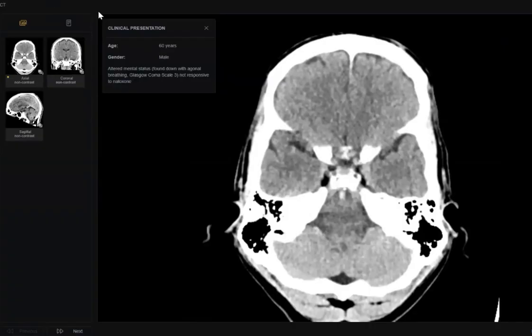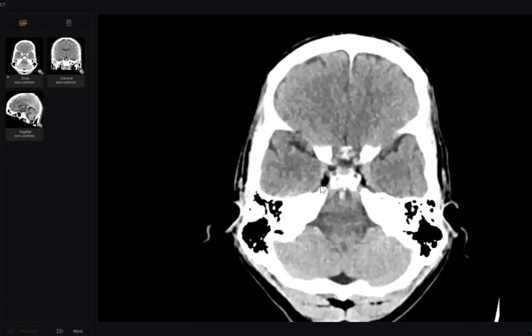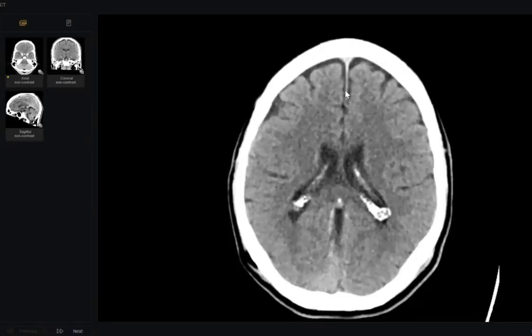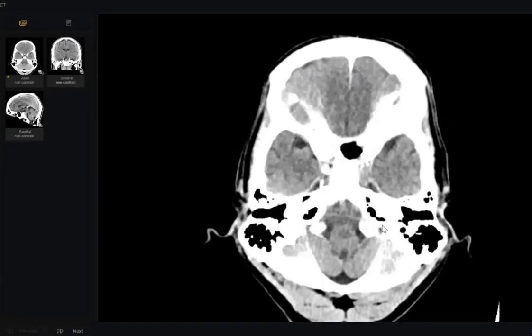An old patient with deep coma and the CT looks normal, without any infarction or hemorrhage. Your next step, before any other review area, is to check the basilar artery. Nothing else. Why? Because basilar artery thrombosis causes severe coma due to brainstem infarction without any supratentorial abnormality. It is acceptable. So that is one key in your exam.